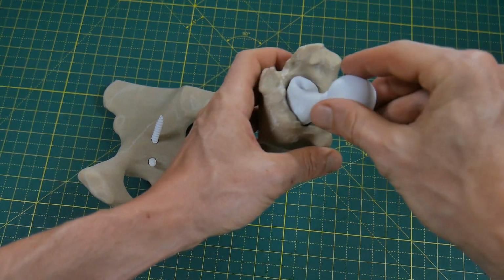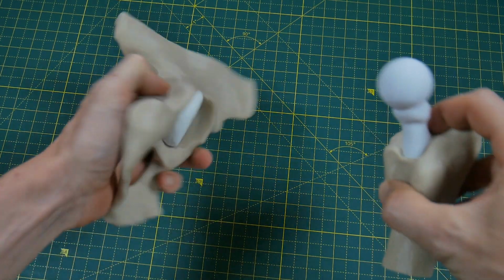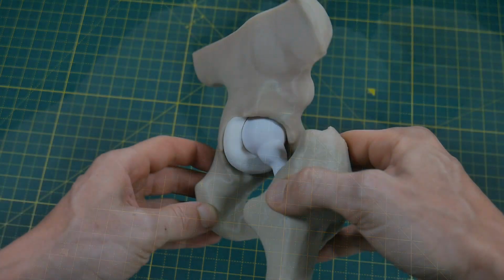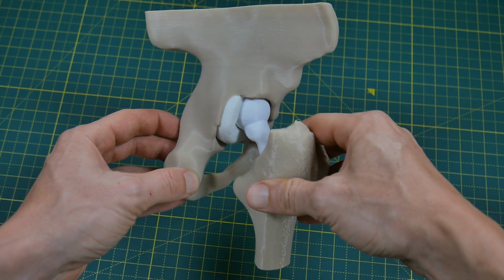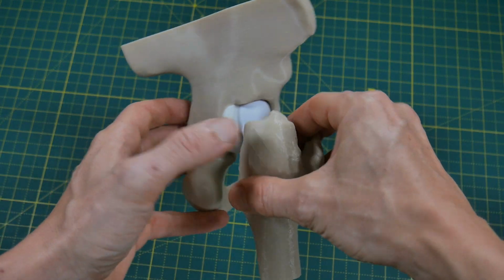The shaft is pushed into the femur. And finally, the ball joint is pressed into the socket seat. The final model gives a very good and precise overview of the special pathological situation of the patient.